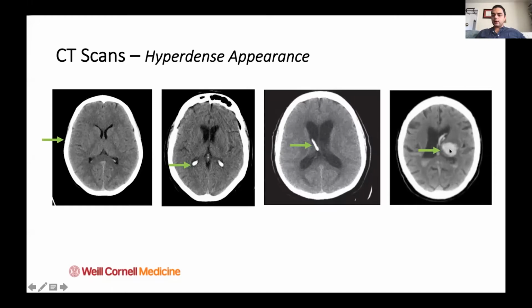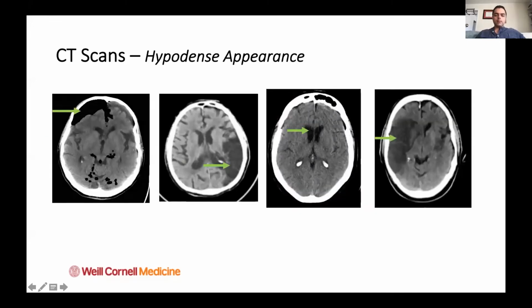And then here was pointing out a basal ganglia hemorrhage, which, because it's blood, is hyperdense on CT. So that's what you're seeing there. Things that are hypodense: air. This is a case of pneumocephalus, so someone that may have had an endoscopic skull-base surgery and developed a CSF leak, can track air into their intracranial space, and that'll be very dark. Air is the lowest Hounsfield unit, the most hypoattenuated thing. As you can see, this is all air right around the patient, so that's very easy to identify.